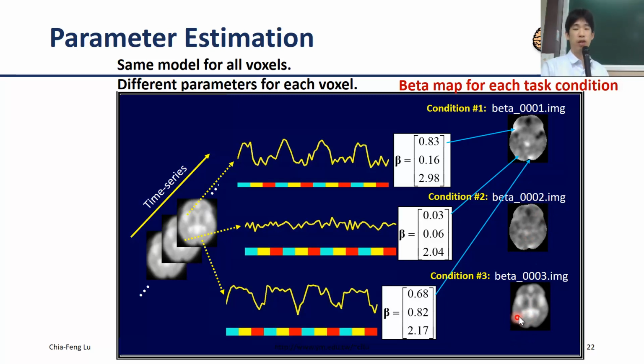And the final one, as we mentioned, is more like the constant adjustment, or the mean value adjustment. You can see the distribution of the beta 3 map is, if you know the T2 weighted image, pretty much like the T2 weighted image. The ventricle area has a higher value to adjust the mean value. Okay, so in this case, we may be interested in one of the maps.